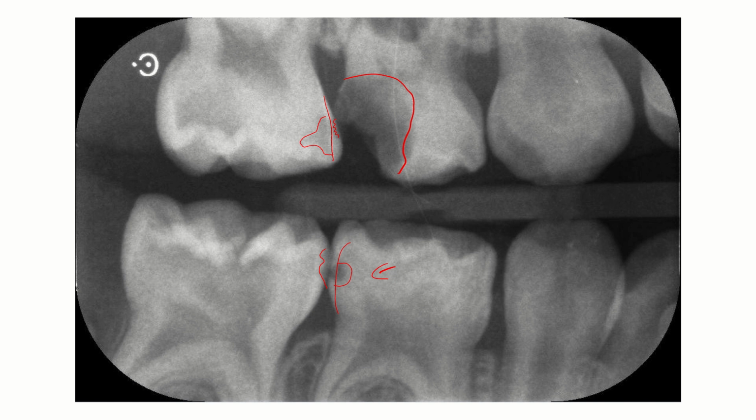There are 2 more lesions, however, in these radiographs that very few of you pointed out. However, they are large radiolucencies. First one is here. So in the distal occlusal portion of the 5-5, that's an extensive radiolucency.